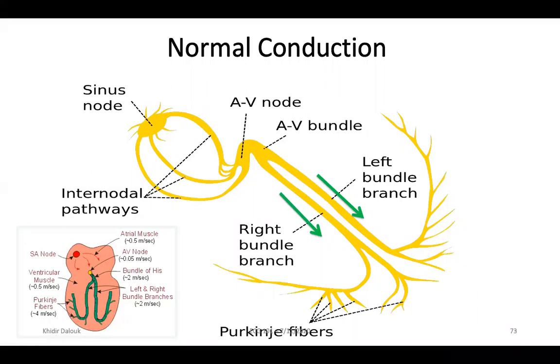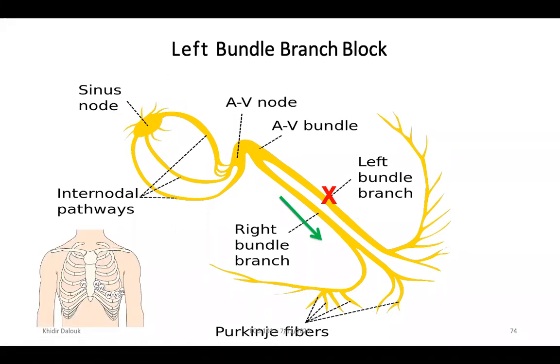Anything going through the conduction system should be sharp and should be short, unless of course you have disease in your conduction system. So if you have disease in your bundles, if you imagine those bundles as highways, and this activation wavefront is going through the highways, and if one highway is blocked, then you're going to have slowing of the conduction system. In this example here, there is left bundle branch block, meaning that the activation started in the sinus node, traversed the AV node and the His, and when it's going down, this left bundle is blocked, activation goes down the right. Still, the left ventricle gets activated. It doesn't mean that if you have block, the left ventricle does not get activated. There is still muscle-to-muscle conduction and small fibers that get the activation through the left ventricle, but it's much slower.